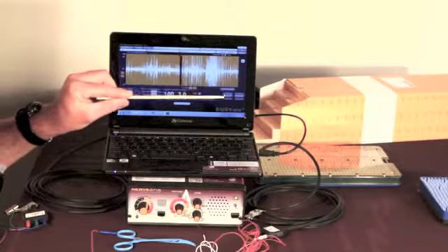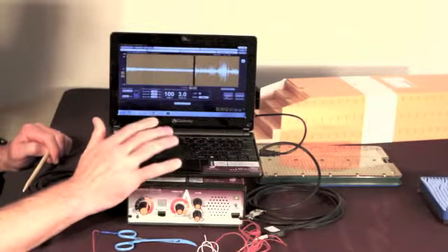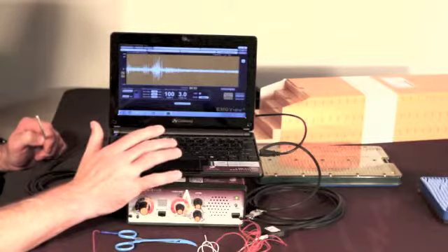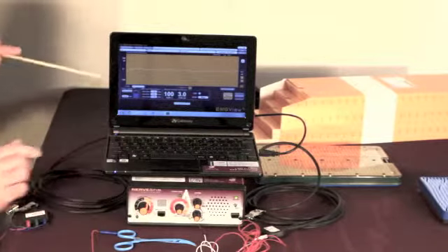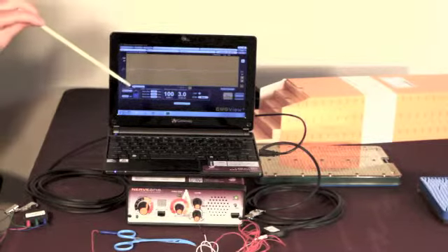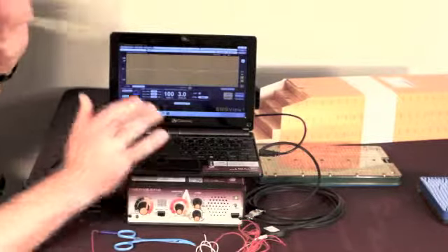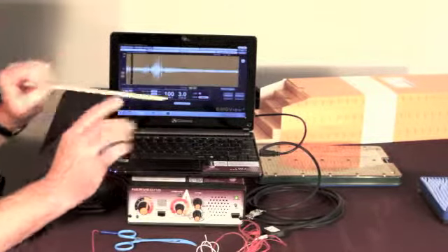Over here, there's a button to freeze whatever's up on your screen, like so. You can see the screen stopped, and by clicking to the evoked window here, you can even go back in time. You click on these little buttons here, so if you're away from the computer and something significant happens, you have up to 10 seconds to walk over, hit freeze, and back up using these numbers. I'm going to unfreeze now by clicking here, and as you can see, it's running again. I'm going to go back to free run mode.